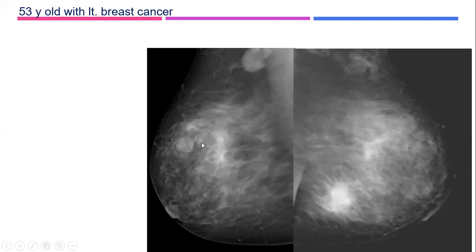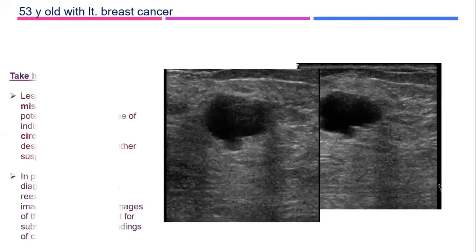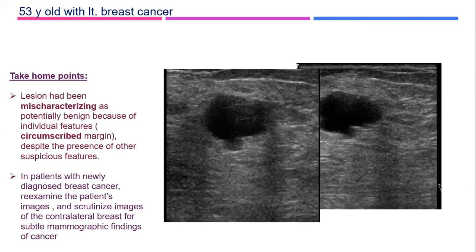Yeah, really, I mischaracterized. I picked up the abnormality, but I mischaracterized it. You see, I misinterpreted it. Because it was echo-free, I couldn't recognize this lobulation. At that moment, I was not concentrating on that area. In retrospect, I have looked at it, you see? And even if you look at it, it seemed to be hypoechoic rather than echo-free, this portion. Yes. Might be this is a cancer adjacent to a cyst or presenting as a cyst.